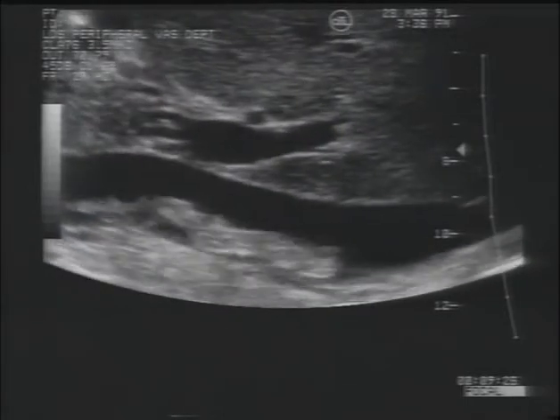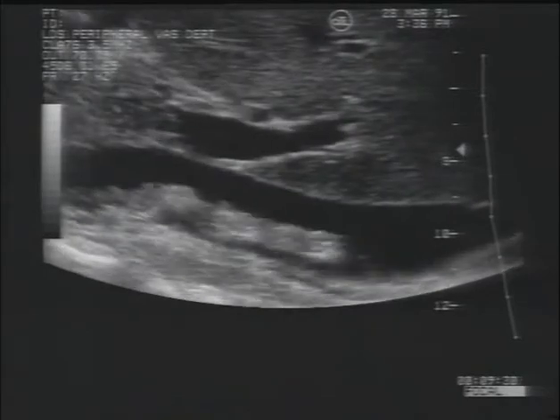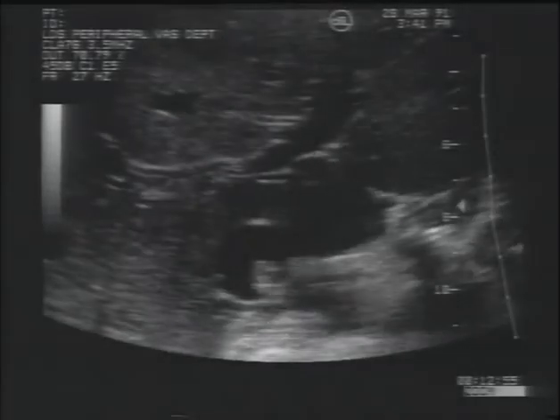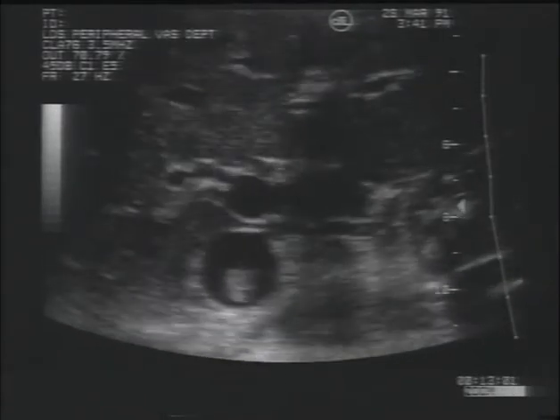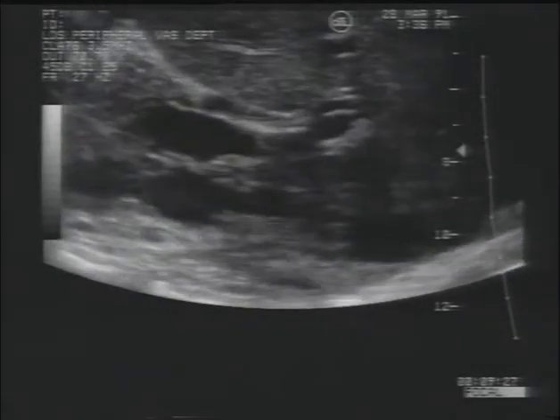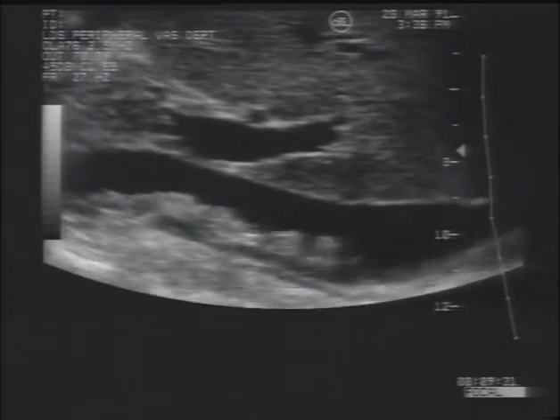As it begins to propagate, however, it can form a long, snake-like tail that extends into the lumen of the vein without any other point of attachment. This poorly attached type of thrombus is displayed quite dramatically by ultrasonographic imaging. It is usually associated with new growing thrombus. As the thrombus ages, it will eventually either lyse or attach more firmly to the vein wall.